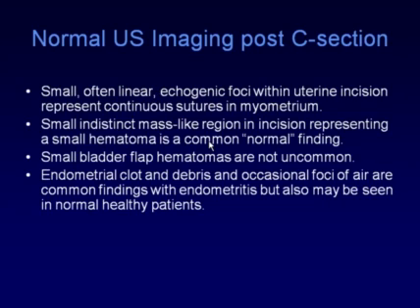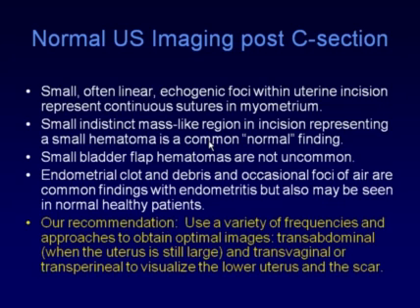Therefore, the appearance of endometritis and a normal endometrium completely overlap, and that diagnosis should really be considered a clinical diagnosis. Our recommendation for ultrasound imaging is to use whatever variety of transducers and transducer frequencies necessary to obtain the optimal images. Remember, the uterus is still fairly large at this point, and transvaginal imaging may or may not be optimal. Transabdominal imaging will often be fine, even without a full bladder, and the woman may not be able to maintain a full bladder. You may actually be able to use a higher frequency curved transducer than usual.